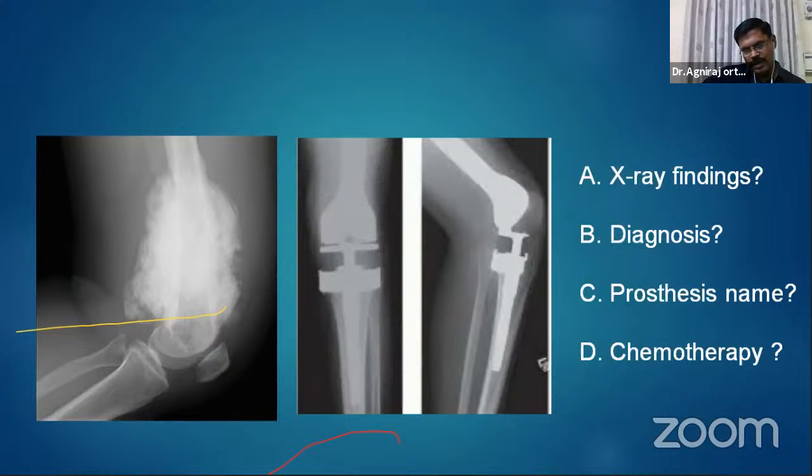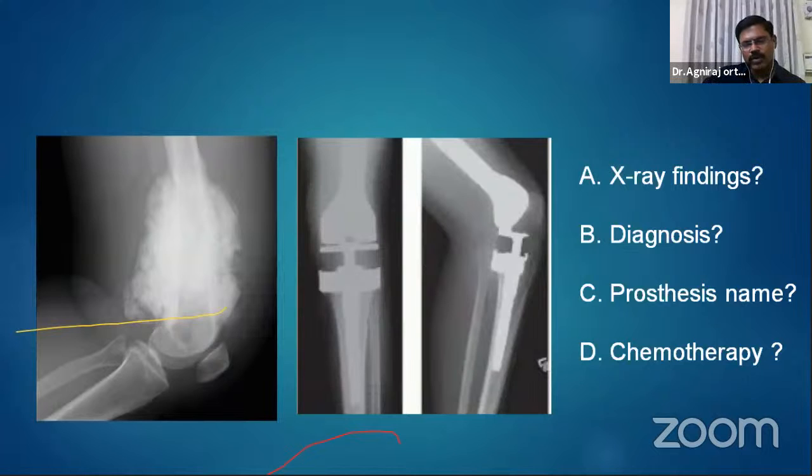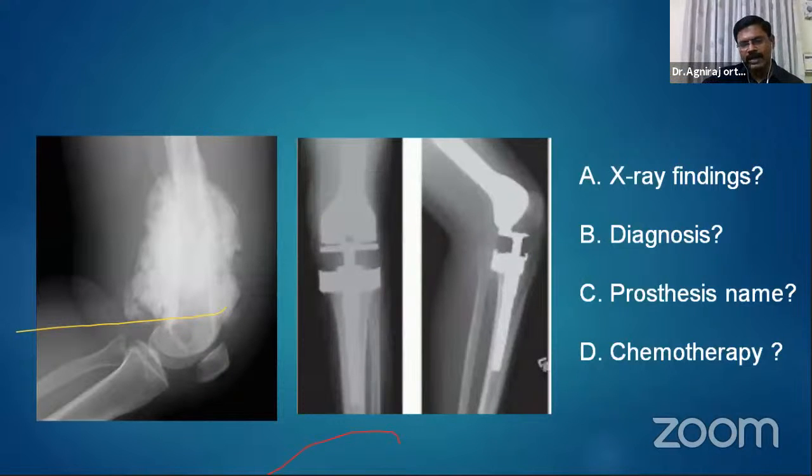Then you should say what is the treatment of choice for osteosarcoma. We are talking about the types of osteosarcoma, the WHO classification. Okay, I think that is not included in this class, so you are finding it difficult. We'll leave that. At least read the nearby X-ray also. What has been done for this highly malignant osteosarcoma of the distal femur? They have done a wide surgical resection and reconstruction with the prosthesis.